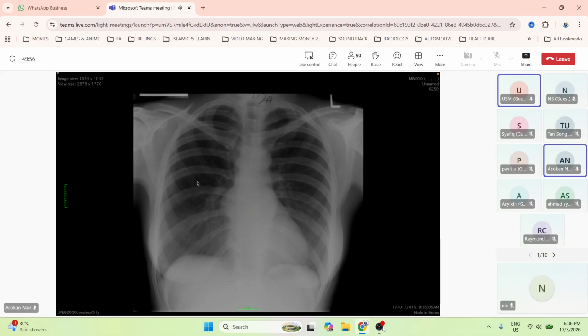Yeah, so now where can you localize it? Where do you think it is? It is at the posterior mediastinum. Yeah, okay. So what's your possible diagnosis here? Differential diagnosis you'll consider at this moment? For the posterior paravertebral, it would be extramedullary hematopoiesis. However, the bones themselves, I cannot really appreciate whether the patient has osteopenia. Again, it's such a rare condition. You all think of the rarest first. Think of the common things first. Okay, like what?